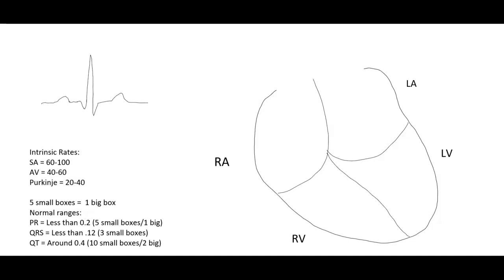So when nurses are looking at a telemetry strip, how are they interpreting what the rhythm is? No, we actually don't just match pictures to what it most looks like. There is some critical thinking involved and a very systematic approach to interpreting what the rhythm is. So first part is you really need to understand what normal is and what normal sinus rhythm actually is.